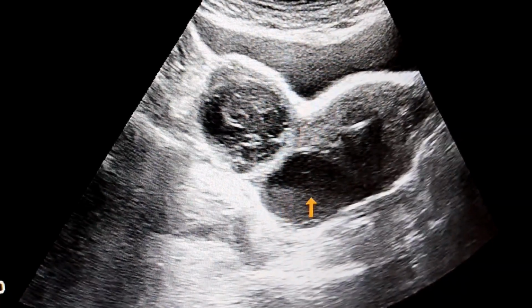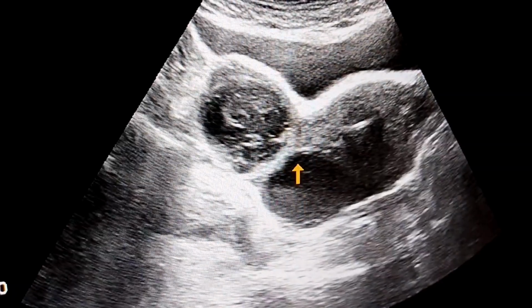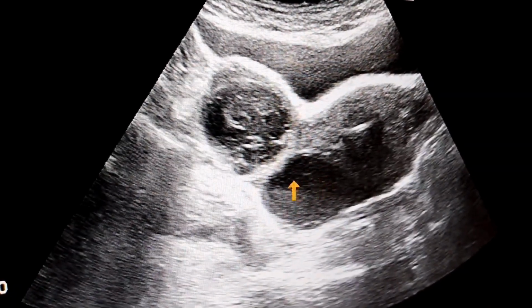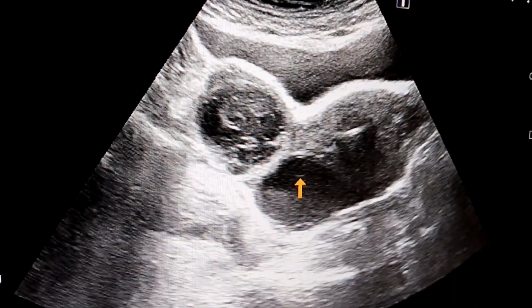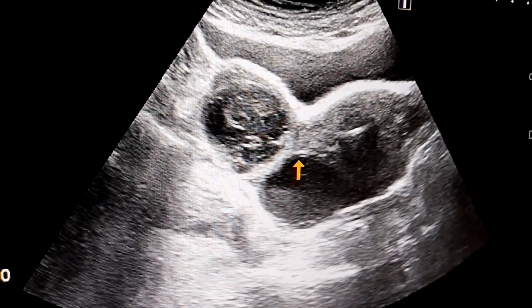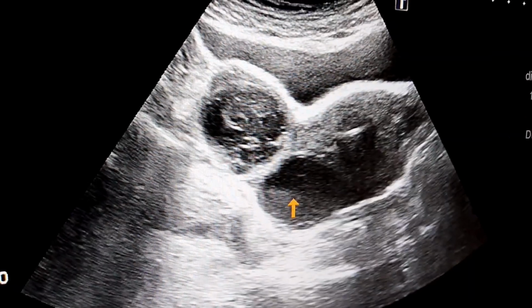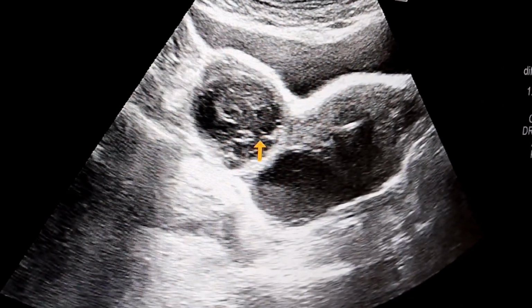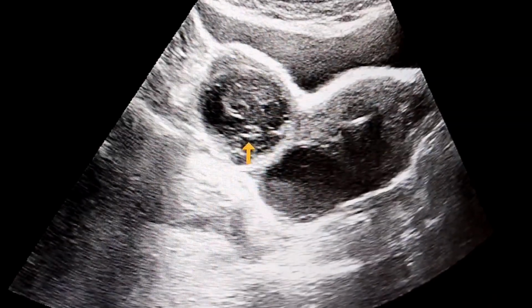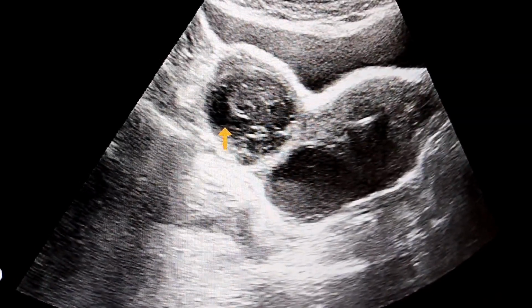So this is the debris which is settled down at the dependent part of the cyst, and this is the clear fluid which is having a little bit of echo. So this is called the fluid debris level. Both cysts are showing the characteristic appearance of hemorrhagic cyst.